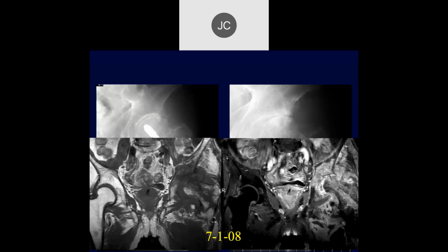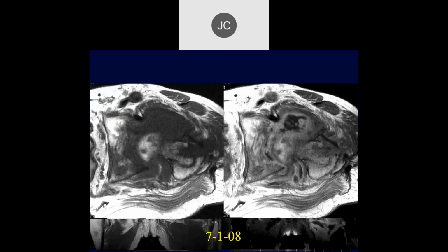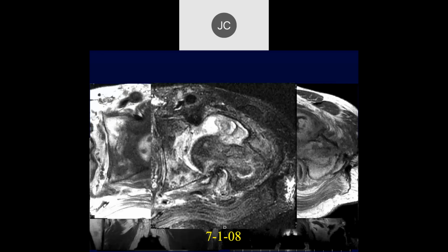Looking at that T1 weighted image, there's a lot of fracturing. Well, edema. Was it healed? Acetabulum and femoral head. Was there any recurrent trauma? No recurrent trauma. Post-op infection. They took out the screw and the nail, and it wasn't healed. That's the problem. And this is all infection.